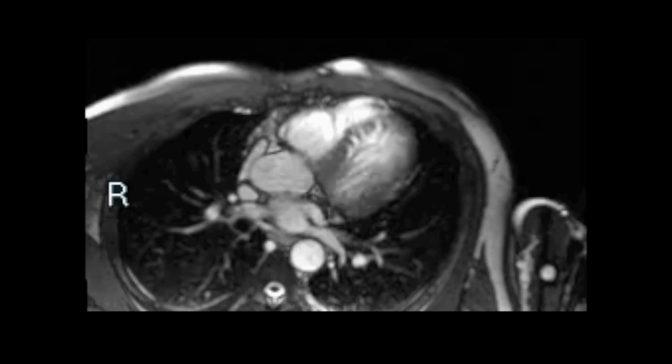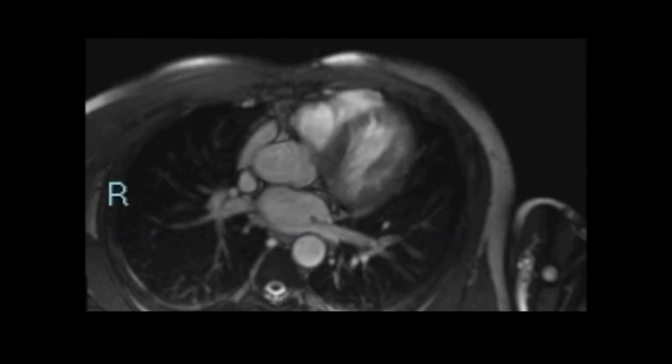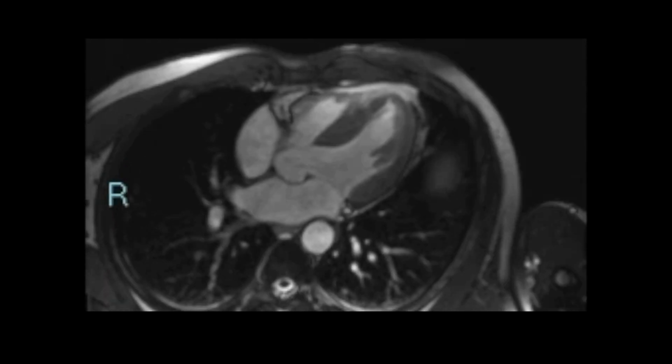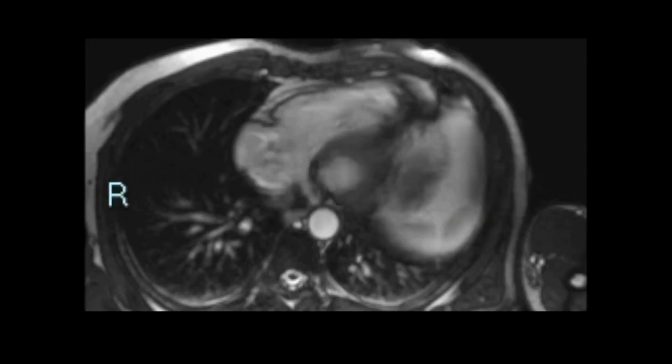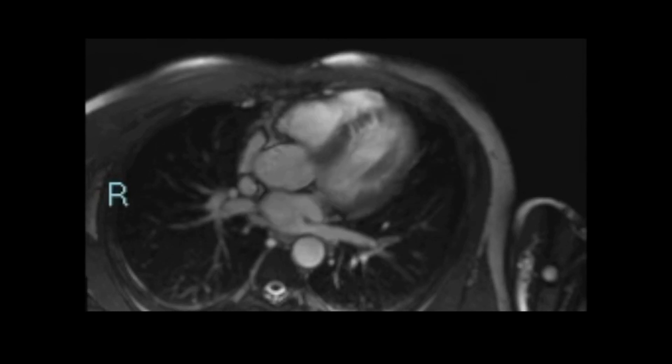A 40-year-old man came for cardiac evaluation because of an abnormal ECG. Cardiac magnetic resonance sequences showed multiple myocardial defects or invaginations in the ventricular septum, suggestive of non-compaction aspects. Analyzing the images, we have two diagnostic hypotheses.